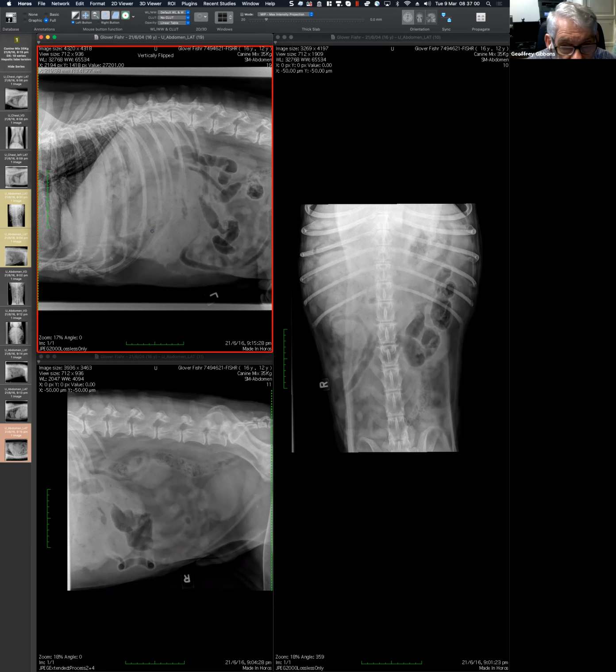Given we've already decided that the gas isn't free in the abdomen, and we have a linear pattern there, I would assume that has to be the colon, if all those things are true. And therefore, how are you going to use that information? Yeah, because the mass there has variable radio opacity. You got muted. I'll stick my neck out and go for a hemangiosarcoma.